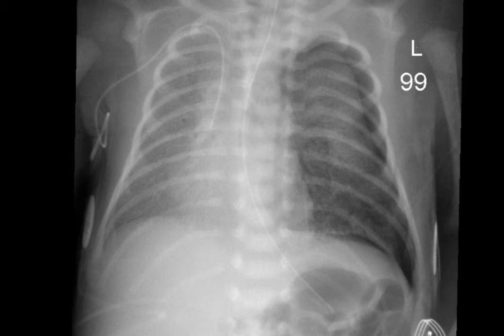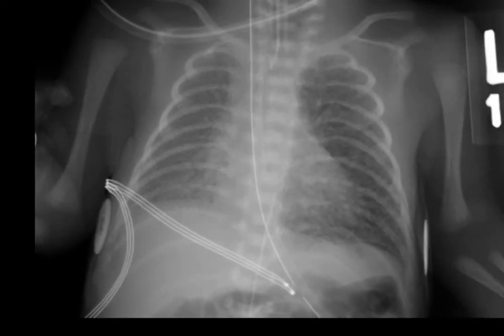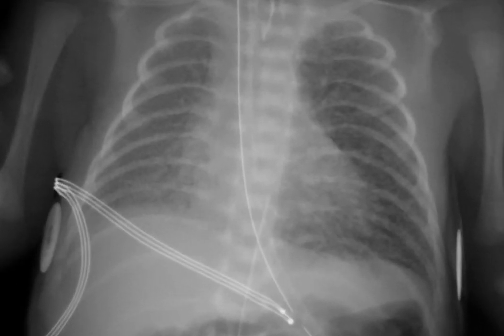This is a patient that has very fine interstitial emphysema, pretty much confined to the left lower lobe, and you can see it has already resulted in a large left pneumothorax with some tension and mediastinal shift to the right. The right lung basically just shows hyaline membrane disease with few air bronchograms. This is another more obvious case. There's clearly asymmetry in the density of the two lungs. The left diaphragm is flatter than the right, and you can see there are focal, linear, and cystic lucencies, particularly in the lower lobe, but probably in the left upper lobe as well.